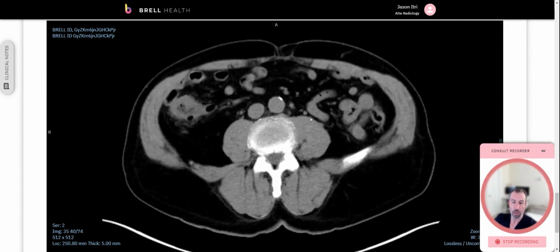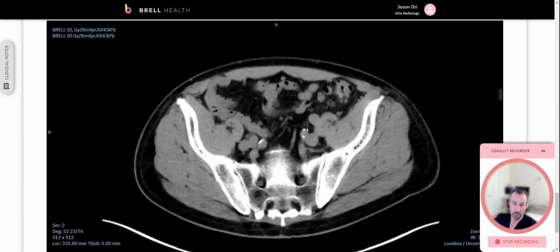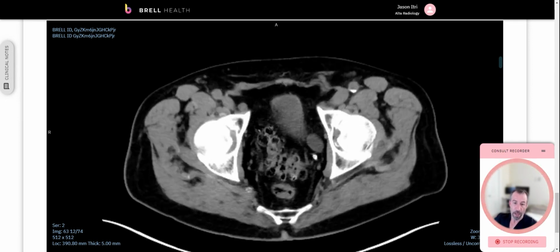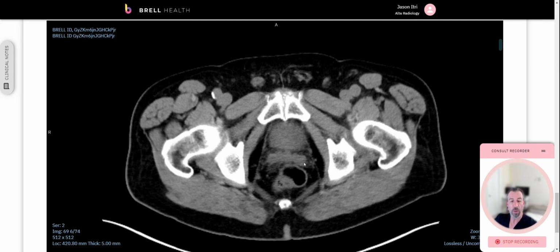It's looking like a normal decompressed ureter. It can be hard to see sometimes because it's decompressed up against the psoas muscle, but we're catching it here again, surrounded by fat. And as we keep going down, we have a stone in the distal left ureter. So that's what's causing his symptoms. Now, this is where it's important for a radiologist to have a systematic approach because we need to be looking at all the important structures on the imaging study everywhere on the image.